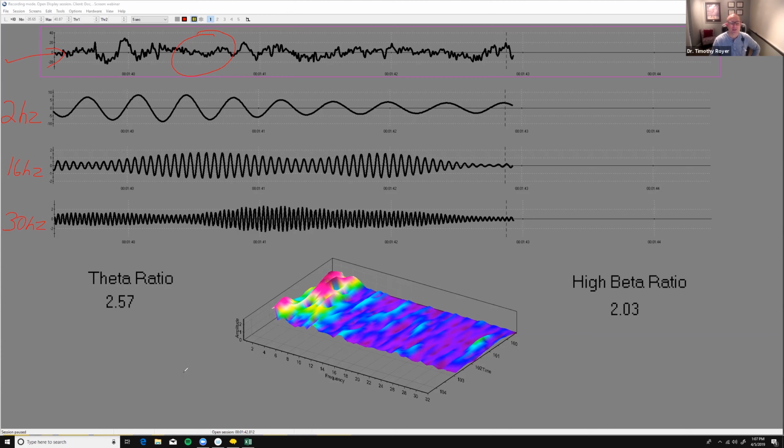Also, you're going to see this a lot when you're doing assessments, okay? This is another representation of it. And you'll notice the scale, 0 up to 32. Those are all the frequencies. And this is how the wavelengths are rising, going into peaks and valleys, okay?